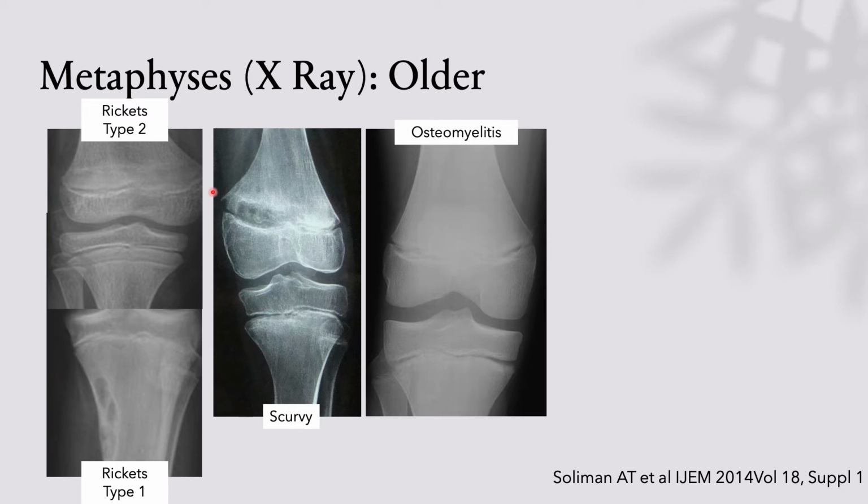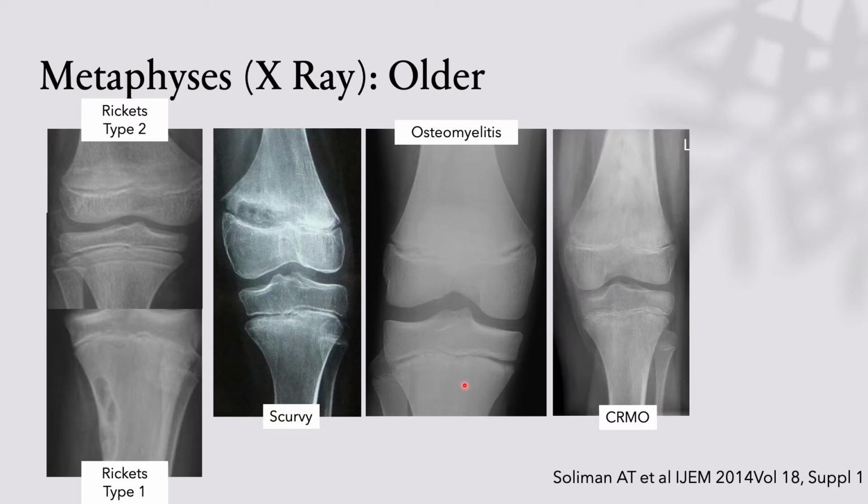Whenever you're looking at a child with knee pain and you can't find anything, always remember to look carefully at the physes. You will occasionally notice areas of the physis that are fusing as compared to the rest. If there is no pain associated with these areas, it's usually nothing. But if there is pain that is attributed to that area, one should look carefully. And I'll show you what this case turned out to be later in this talk.